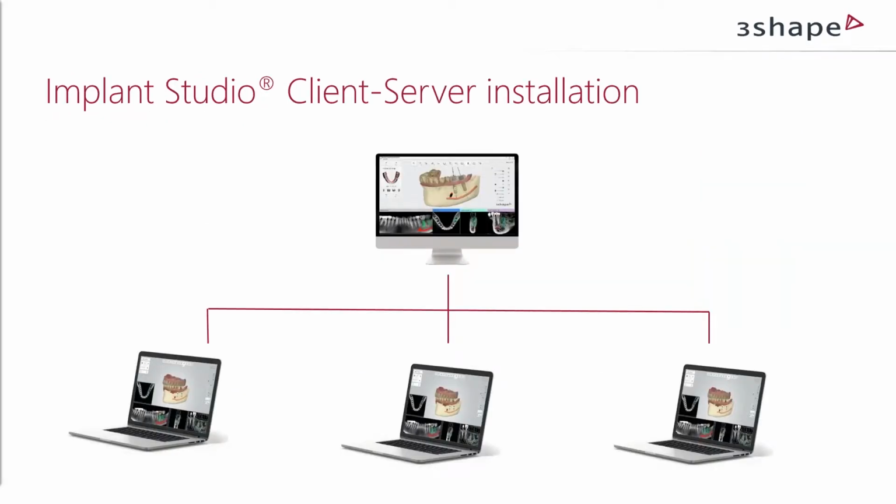Now it's also possible to install Implant Studio as a client-server setup. That means that all the orders will be stored on a server PC. Well, not stored there, but it will be the main computer with Implant Studio, and then you may have some other computers in the same local network connected to the same server installation. That means that you will be able to access the server computer from a client computer in another room, for example. So this client-server installation is now available.